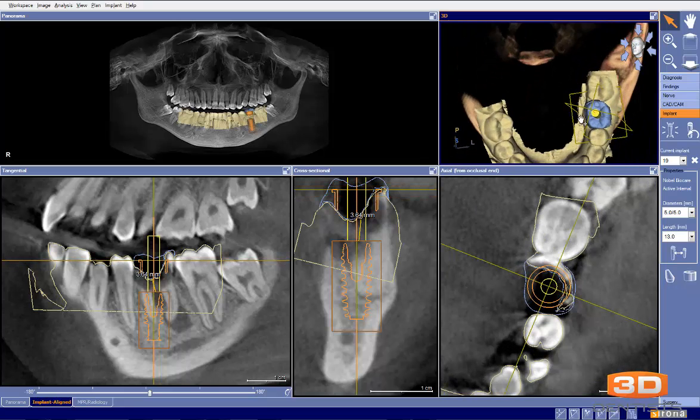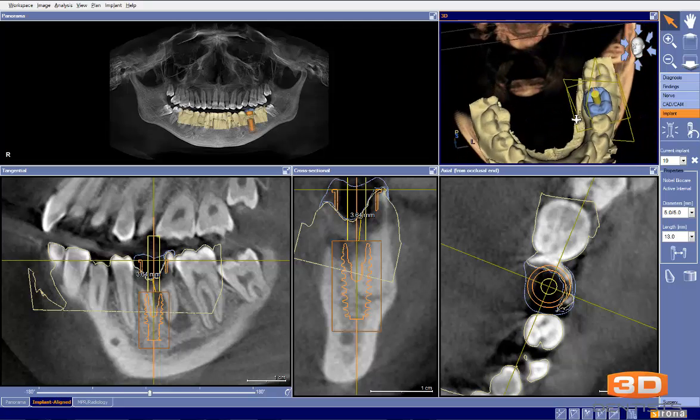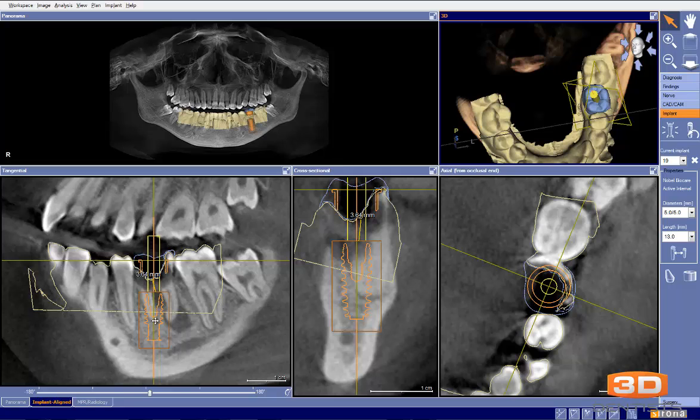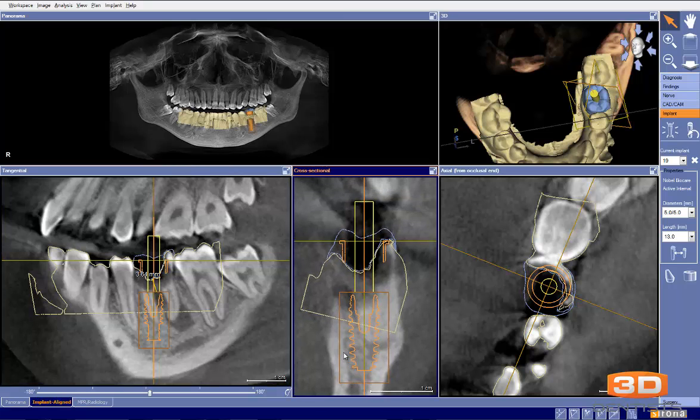So in looking at again from the occlusal view, we can see that we're still centered and everything is coming out the screw access. But now we also, and truthfully we could probably fix that a little bit more like so, and now we have a more accurate occlusal plane that will properly support the occlusal forces of our implant.